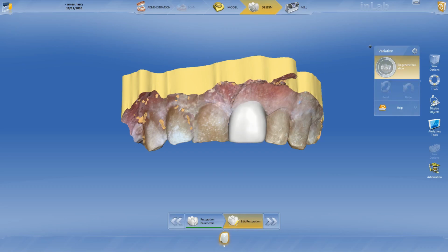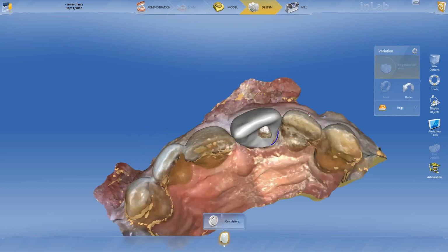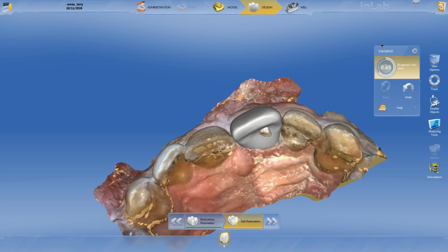And honestly, a good way to decide where I'm going to end this, I look at the wear on the incisal. As you can see, it's a lot more flat right here. This doesn't have as much wear, so let's find something with wear, like say this one. This matches the natural dentition best, and that's how I'll decide where to stop with the biogeneric variation. So that's where we're going to stop, about right.